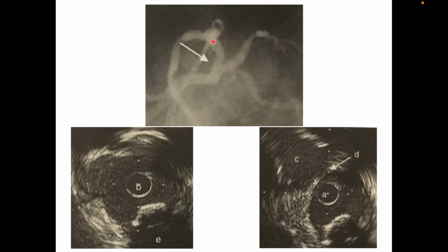So this is a still image in which the IVUS catheter is being pulled back from the LAD. So as you are pulling back, you see this image. So there is the circumflex, and then this is your IVUS catheter, so that's your main LAD. But then you have something here also. Is that an artery as well? Well, that's just calcium, and that's a dropout shadow. Whenever you have calcium, you can't see the vessel behind it, so that's called a dropout zone or dropout shadow. So that's not a bifurcation. This is a bifurcation, and that's the carina. And what's the evidence for it? As you pull it further back proximally, this opens into it and becomes one artery. That carina disappears and it becomes one artery because now the catheter is in the left main stem.